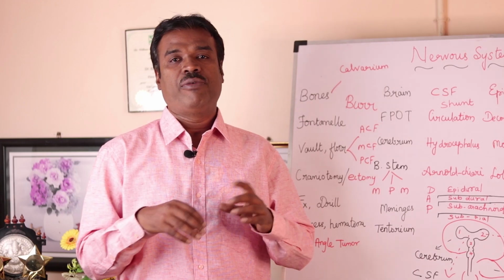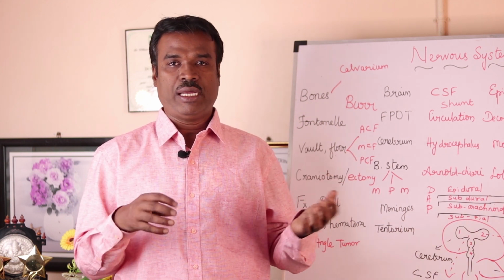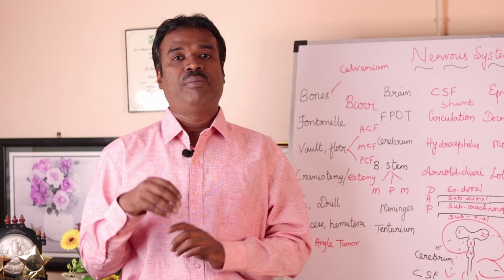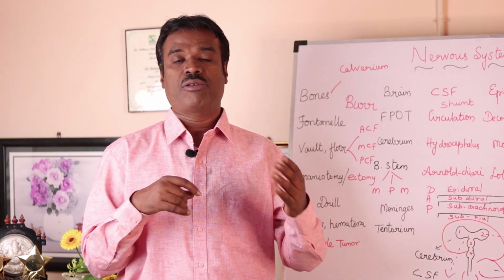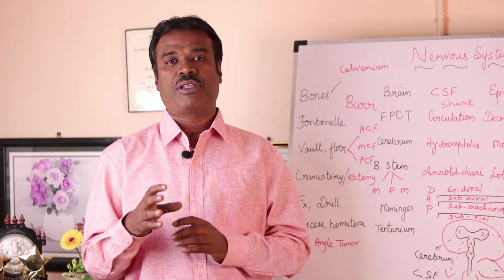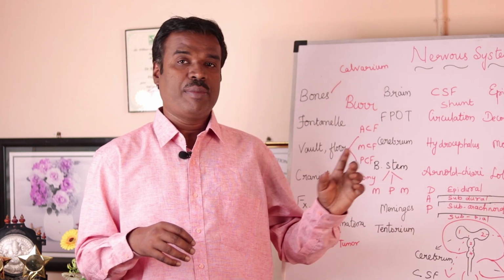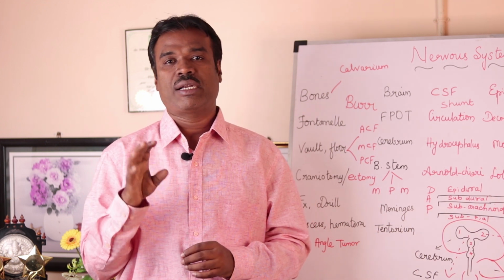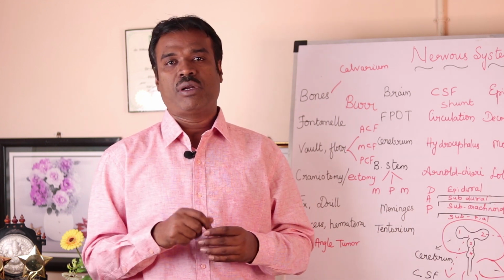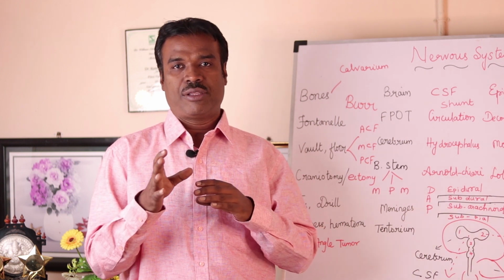The physician will monitor the activity of the brain via these monitoring or depth electrodes, and then, in a more radical approach, he can also go for a lobectomy of the particular part of the brain where there is excessive activation of the epileptogenic focus. And coming to SRS, which is stereotactic radiosurgery, here what happens is precise location of these targets.